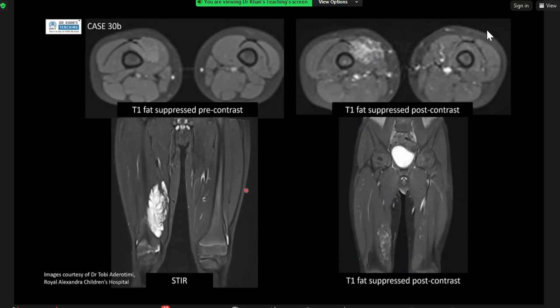So when you see that, some clinicians, if they wanted to operate on it because it's very extensive, will ask you to do an MR. And MR just shows you, so these are the post-contrast pictures, and the post-contrast and pre-contrast ones showing just cystic spaces or cystic signal ill-defined lesions, but they look quite bubbly. And in post-contrast, depending on how delayed you acquire these images, you can get enhancement within them. Okay, this is more on the difficult spectrum, but it's just to complete.